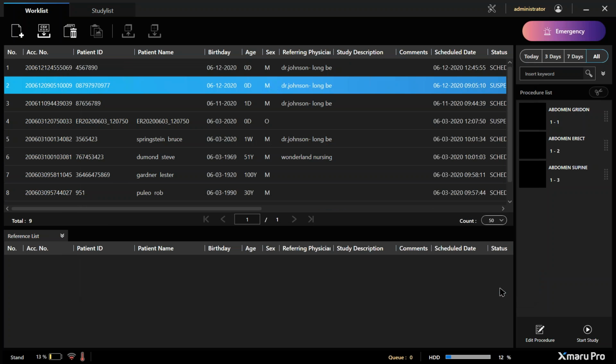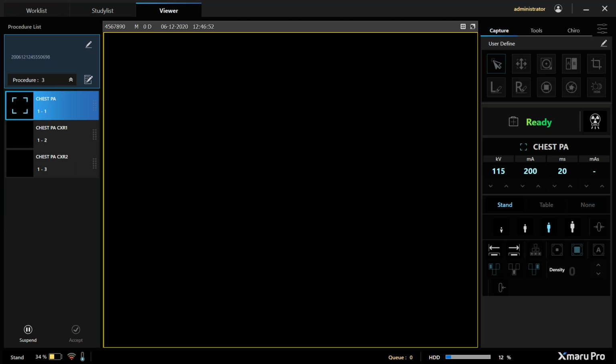When you go to capture, again, it will move to a new display. There's a couple changes here also. First of all, it's laid out right now with thumbnails on the left, processing features, and generated techniques along the right. You can reverse this order, but these to the left and these to the right. So you have the ability to customize it. I happen to like it this way. I like my thumbnails on the left, and the processing features on the right.